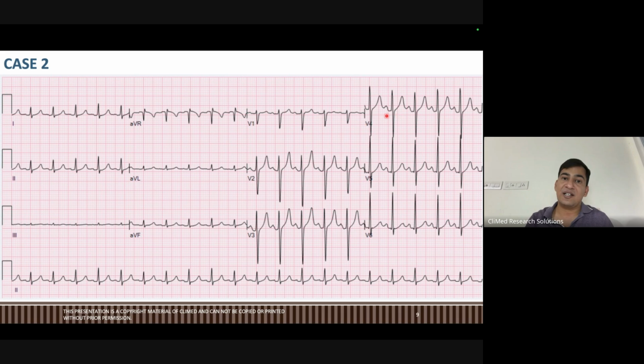Here there is similarity. This is consistent and follows the normal ECG pattern. QRS complex, T wave, P wave. Here, look at this. QRS complex, T wave, P wave. And here it is visible.